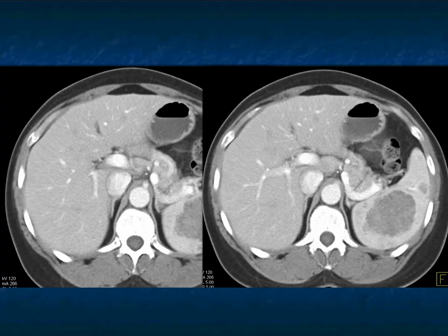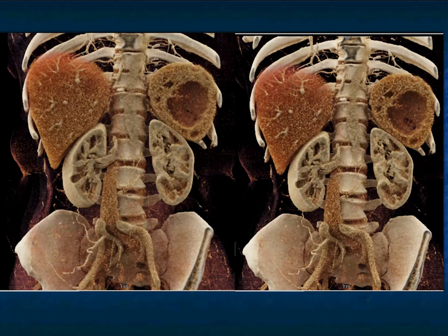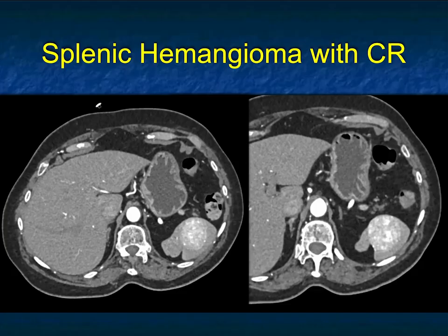Here you can see a dominant mass with multiple smaller lesions. This is where hemangioma is a tough diagnosis to make without any further history, without further imaging. Here it is very nicely on the cinematic, the dominant mass and multiple smaller lesions. And again, this hemangioma, as I look at cases that can be challenging, again, this idea about angiosarcoma, metastasis.